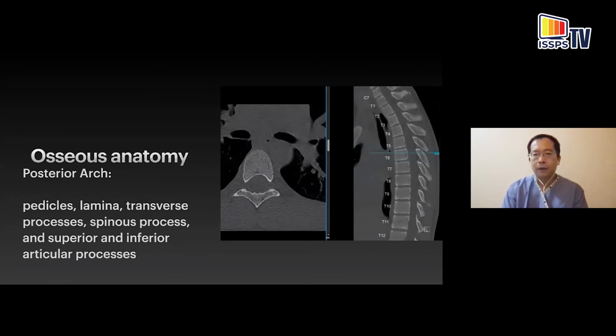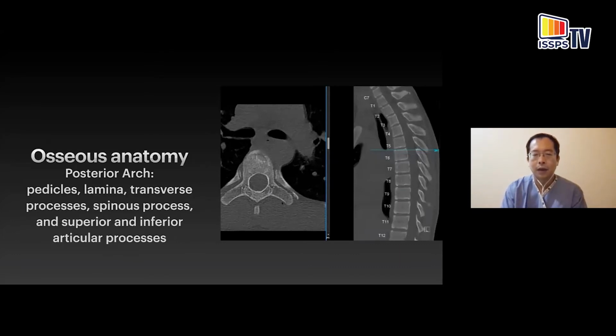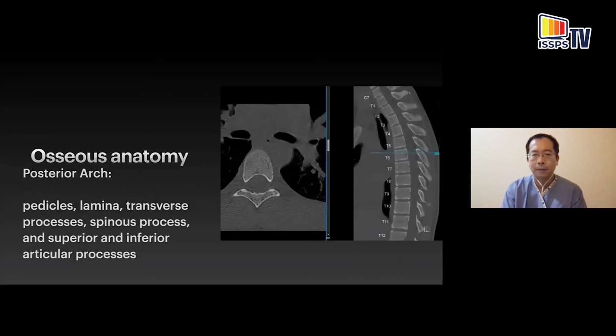Moving slightly more inferiorly now into the upper end plate of T6 vertebral body, the spinous process of T5, we've crossed that. We've now popped under the transverse process, and you can see bits of the lamina. And down here, space potentially filled with ligaments, with vessels, and also nerve roots, approximating the thoracic paravertebral space. So this is an important landmark just below and inferior to the transverse process. This here, of course, is the vertebral body and the thecal sac and the spinal canal.